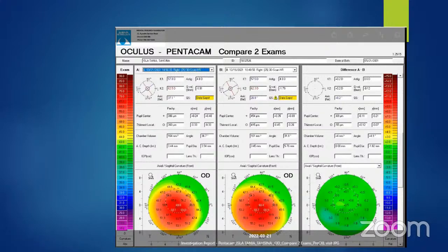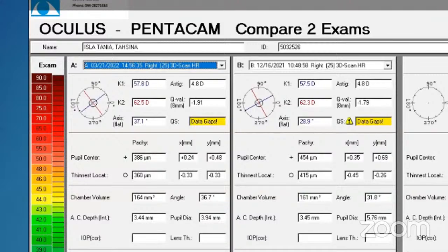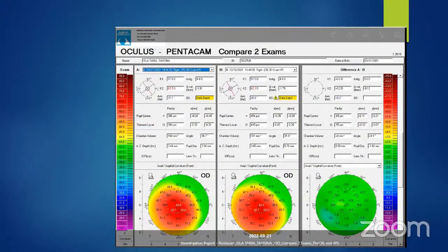Another thing is that when the Pentacam is trying to see the thickness, because of the scarring there is a false value, and it may say that it is thinned out much more than it actually is. The opacity from the haze will always give you a lesser value. If you use any other method which is not optical, your values would be different. So you don't have to get worried. Now that you have done the CXL, you keep following up with this particular scan, which you do roughly a month or 3 months after the CXL is done.